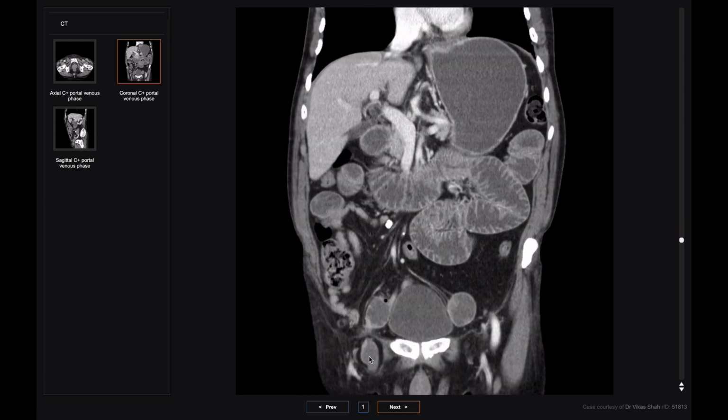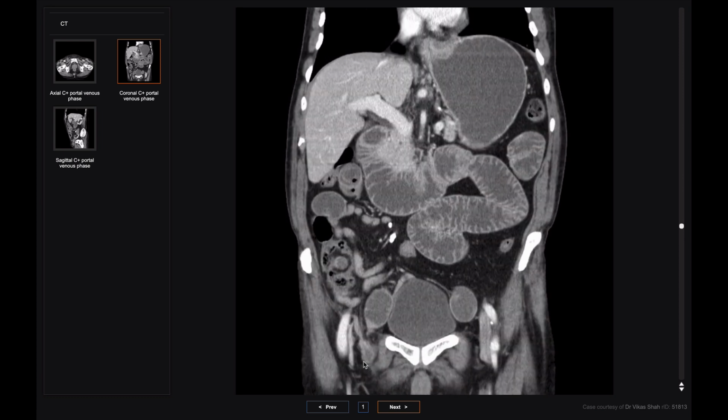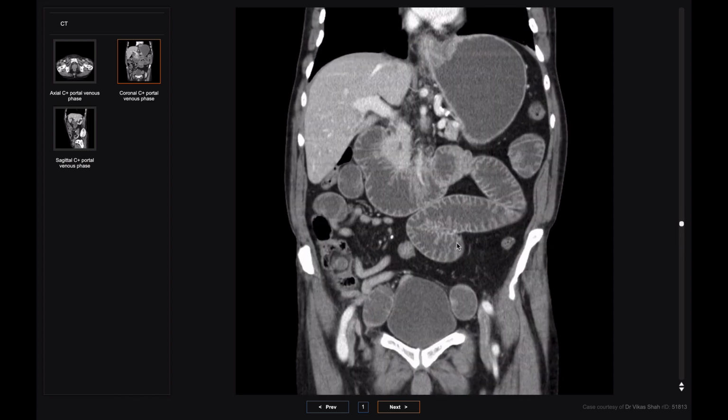which is the femoral space. So this is a femoral hernia with tight pinching of the bowel at the neck causing obstruction, and all the bowel that's coming out of the hernia sac and then heading towards the cecum is collapsed. So that's the downstream limb, but everything upstream from this is very distended. So this is a femoral hernia causing bowel obstruction.